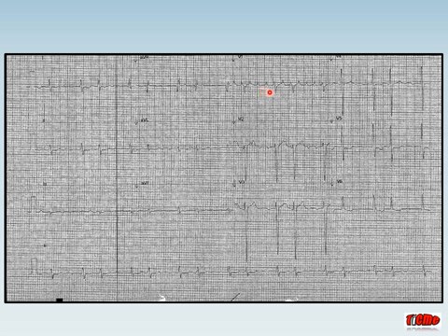They're going about once every big square, once every 200 milliseconds. What does that work out to be? Well, that's 300 times per minute. And once you see that there are regular blips at 300 times per minute, the diagnosis becomes quite obvious. So this is atrial flutter. These are flutter waves, and there is variable block at the AV node. So we have 2 to 1 block, and then 4 to 1 block, 2 to 1 block, 4 to 1 block.